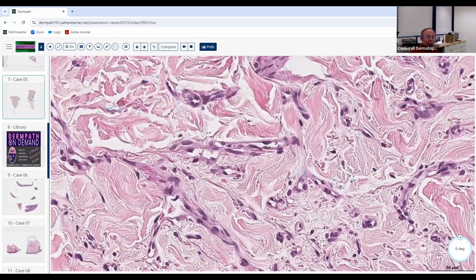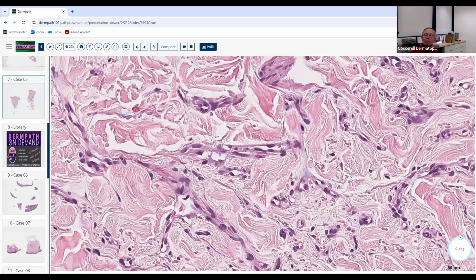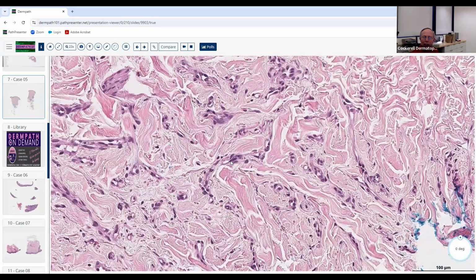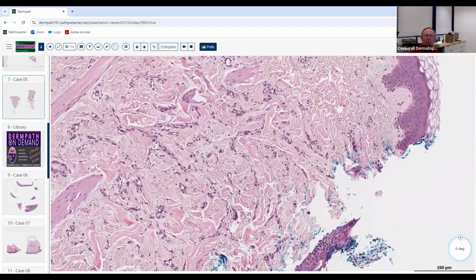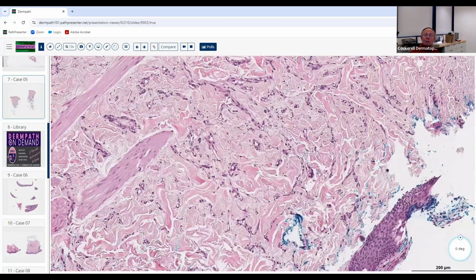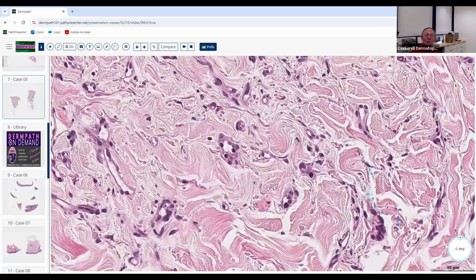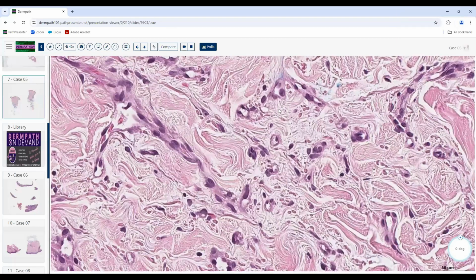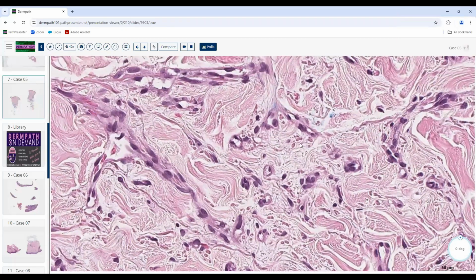We don't see that in Kaposi's. We don't see that in angiosarcoma. It's usually seen in benign vascular proliferations like hemangiomas and things of that nature. So that's another helpful clue to this. Now, this is an unusual vascular lesion. You may have had a chance to study this and learn about it if you guys choose who's going to do which lesion. So what's the diagnosis here? Microvenular hemangioma. Yeah, it's microvenular hemangioma.